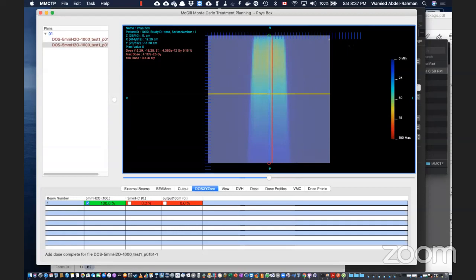It is Little Endian, right? Yes, it is Little Endian. When it was reading all the images, in between it stops suddenly. Okay, maybe I'll export it again once more and check it. Yeah, okay.